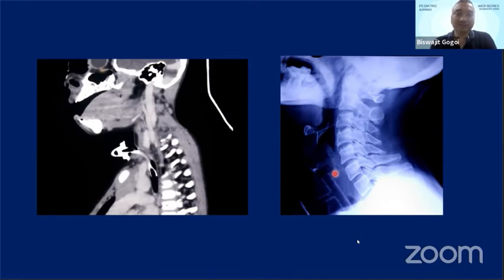But if you can see here, there's enough soft tissue hugging the Montgomery tube, so it's not ideal to remove. Endoscopically we can see the superior end and the lower end, but it's very difficult to see the middle portion where it hugs the Montgomery tube. So a simple X-ray can say whether we can remove the tube or not.